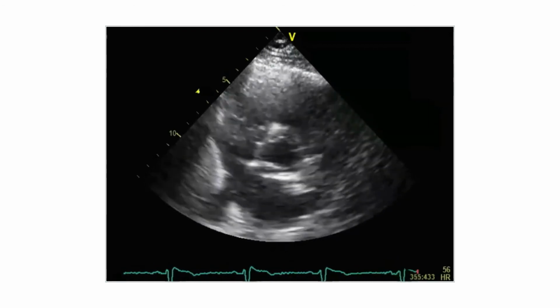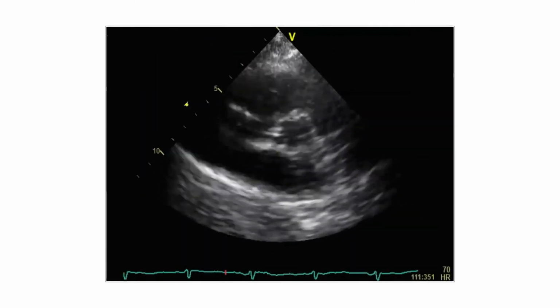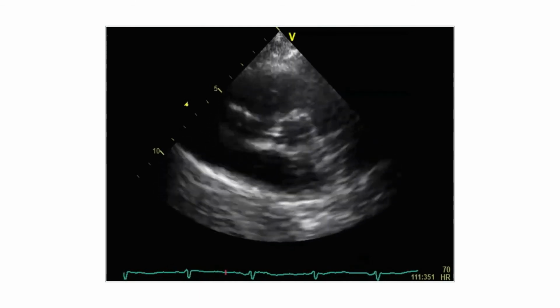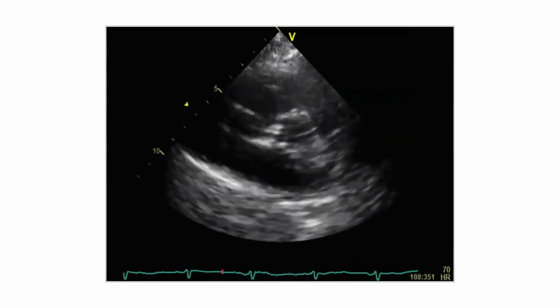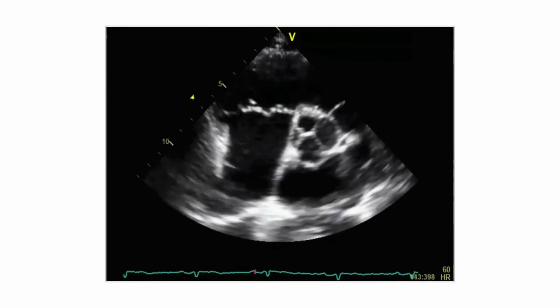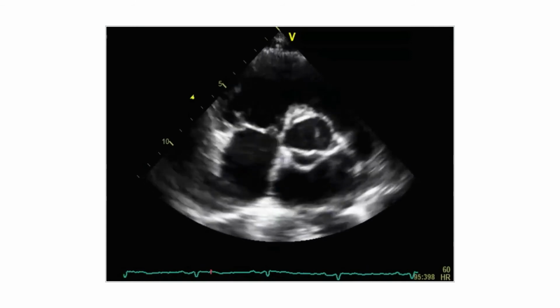And make your choice in the meantime. Here's the third example with again aortic valve, not really easy to say out of this example, and the last one. So this is the fourth and last example.